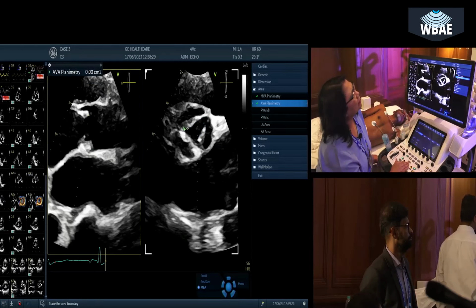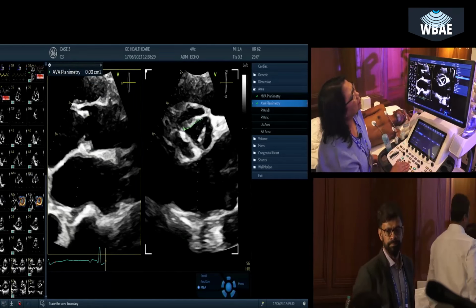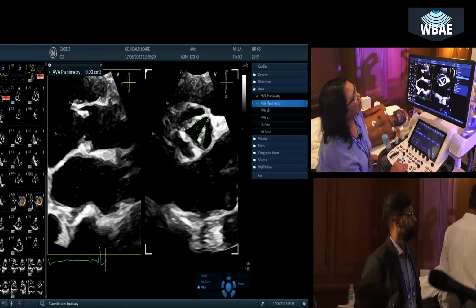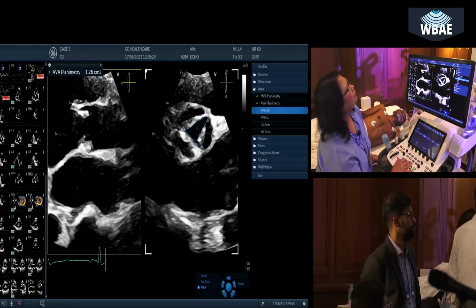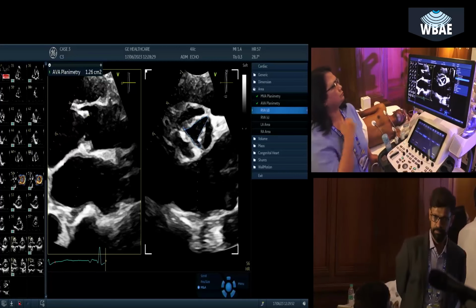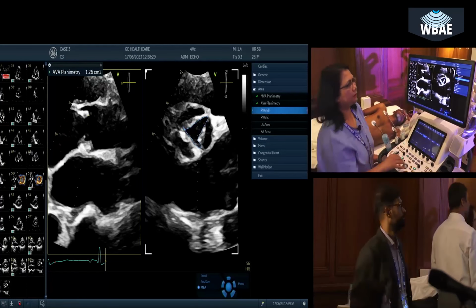But remember, the aortic valve is never exactly at 90 degrees to the aorta, and the aorta itself is not at 90 degrees. There are a lot of horizontal aortas and horizontally placed aortic valves. So you have difficulty in getting the cross-section view, the en-face view. But the guidelines do recommend that you should do planimetry.